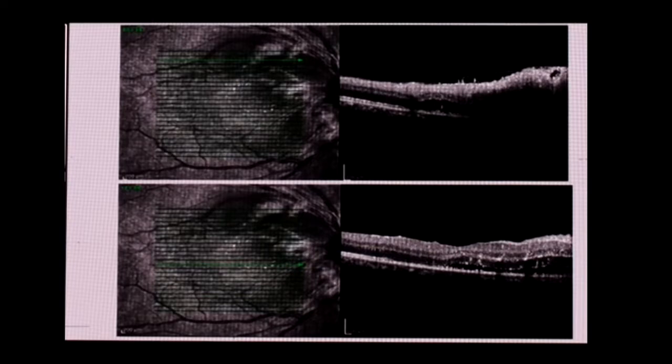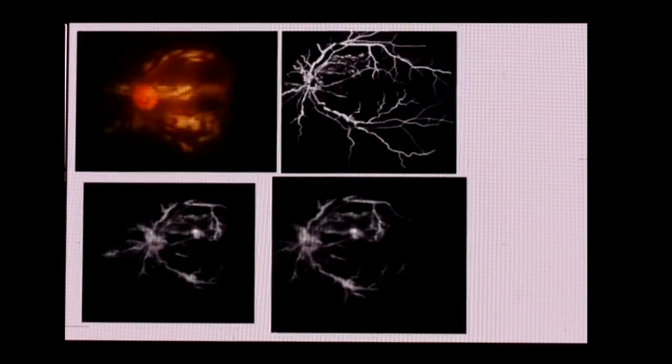So, there is a lot of overlap, and unless you have a lot of cases to really say this is a biomarker, it is difficult to really comment. But what is interesting is many of our patients with post-fever retinitis land up with a lot of exudation. So this is one such patient, and if you see, there are these lesions over here, probably something like a RAP lesion, but there's so much exudation, and these patients did very well with anti-VEGF and Ozurdex injections.